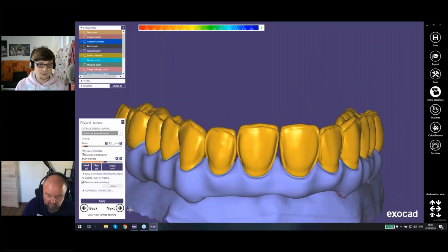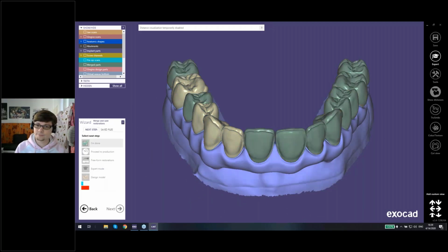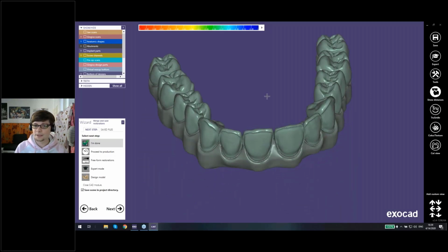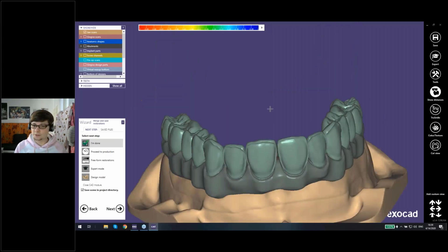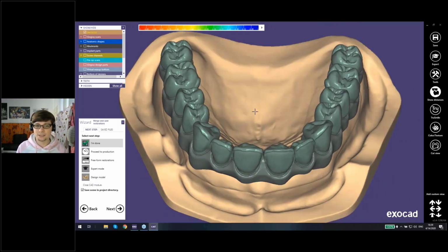Okay. So moving to the next step. Again, the freeforming as always. And now it's the same. We get our finished design for our crowns. And that's it actually with the complete workflow for our thimble bridges. There are 2 different workflows which make complete sense based on the structure of your laboratory or the case itself. So I think it's all there for everybody, however you want to design those bridges.